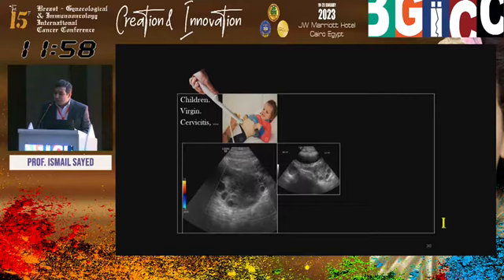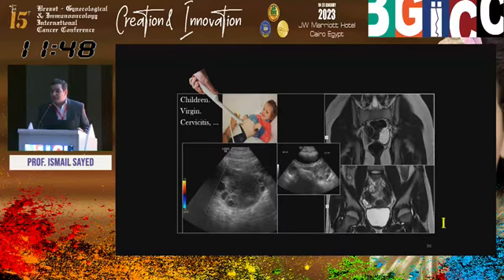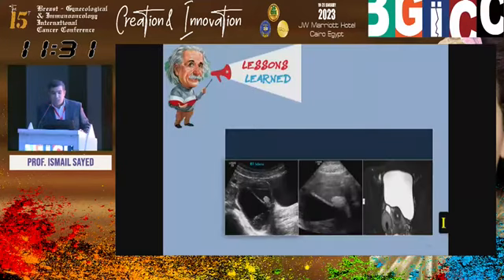I told the clinician it's ovarian torsion. He didn't believe me. I told my colleagues in radiology, ovarian torsion. They didn't believe me. No pain. So we complemented with MRI for confirmation and documentation. Transverse orientation of the right ovary, small size. Vertical orientation of the left ovary, stromal edema, and it's confirmed, and alhamdulillah saved. Operation done within less than 2 hours.